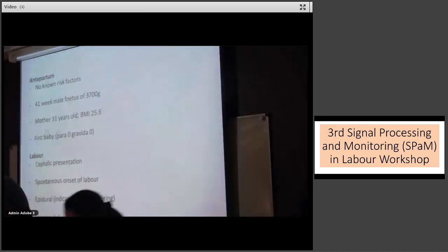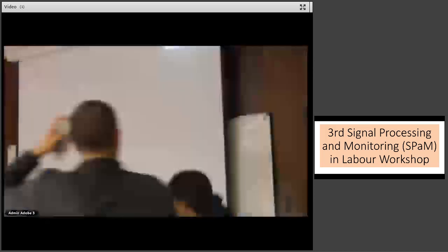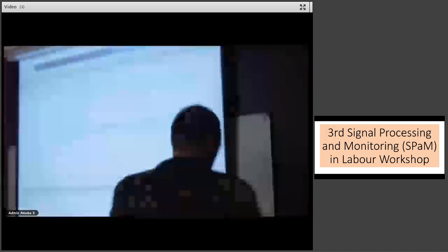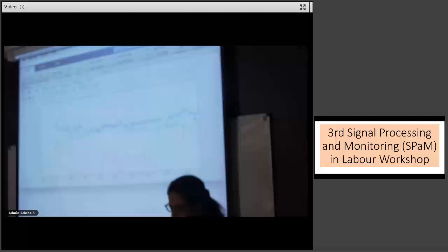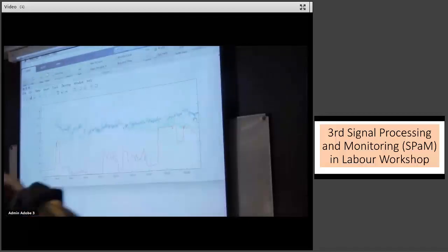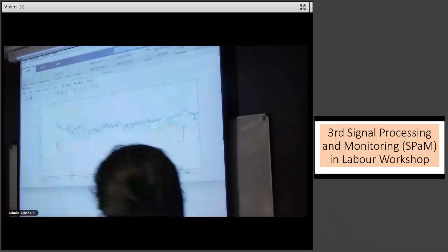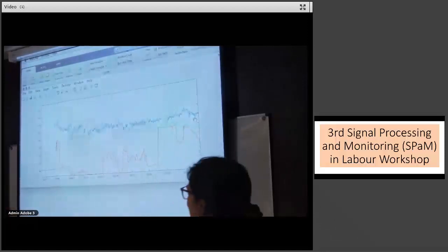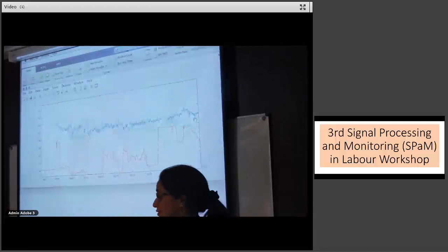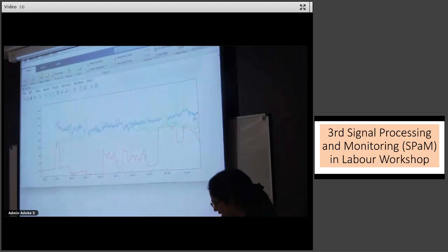You tell me stop if you want to continue with the trace. So Ines, the 3.7 was after the baby was born. We don't know if the baby was fine. This is antepartum, and only the final weight is in there. Okay, but the forceps.